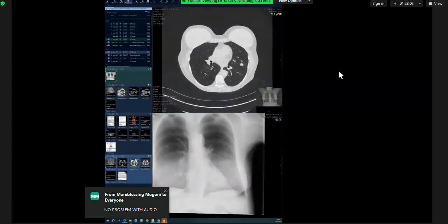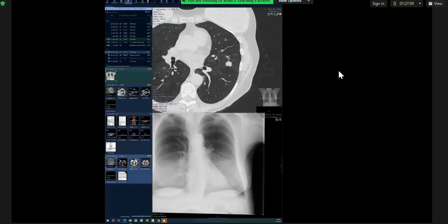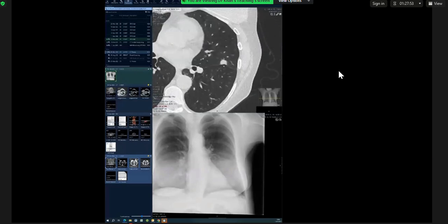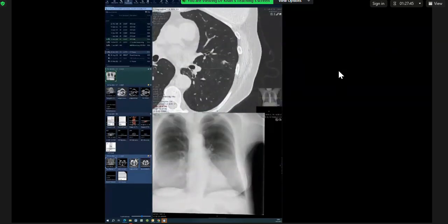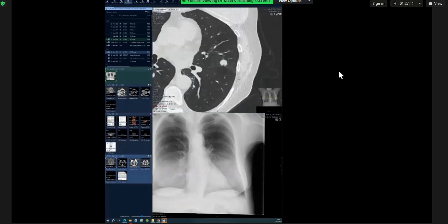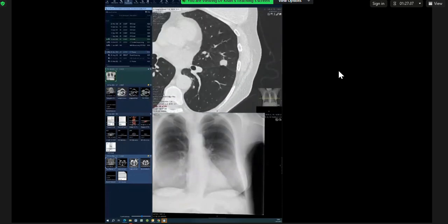And here again, you said all the right things, but you didn't say them in order. And I think that was more nerves. So if you say solid nodule, spiculated margins, then you have to say what it is doing around it. You have to say tethering of the pleura, suggestive of malignant pathology. Then you have to say no cavitation, no calcification, and so on, which you did, but they went in a haphazard pattern. But I think this was a strong pass, this case.